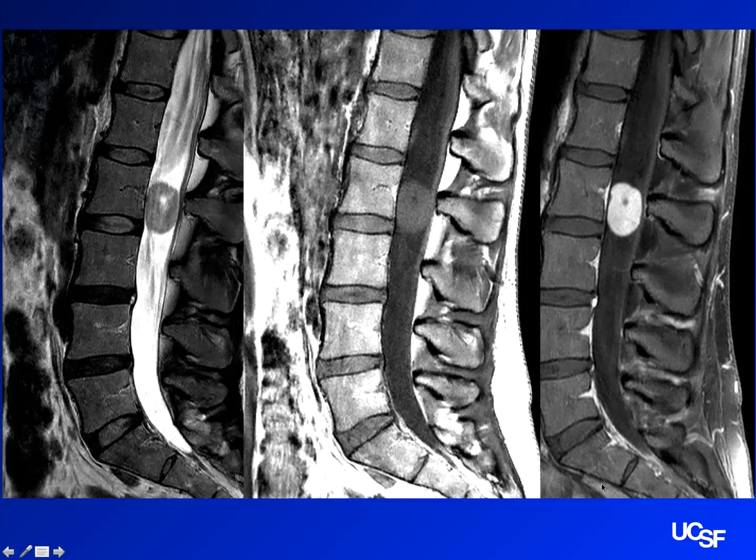That is a post-contrast. So we didn't talk much about that, but the best way to tell if it's post-contrast is, well, one, there's an enhancing mass here. But the epidural veins, like the epidural venous plexus, is enhancing. And the reason this looks different from the original T1 is many times the post-contrast have fat saturation, just to, like I said, exaggerate the differences, because otherwise you can have lesions that enhance the same as fat.